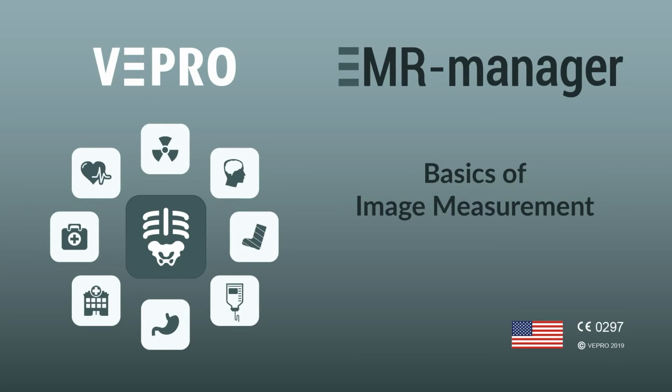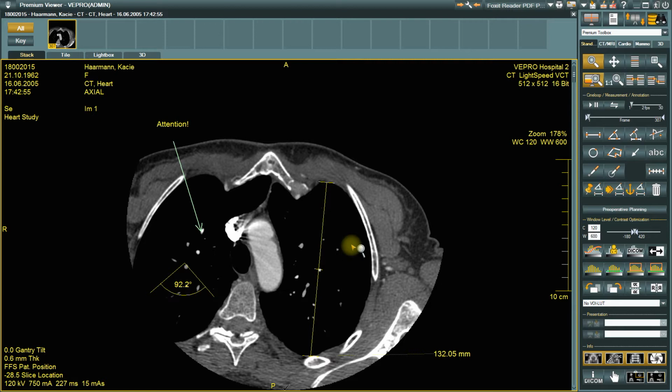Basics of image measurement. The basic rule is that the accuracy of an image measurement will depend on the zoom size as well as the image resolution. In order to be able to place the measuring points precisely, the objects for the measurement must be displayed as large as possible. You can enable the desired measuring function by left-clicking on it, and the button will be highlighted in yellow. The mouse cursor will change to the measurement symbol as soon as you move it over the image.